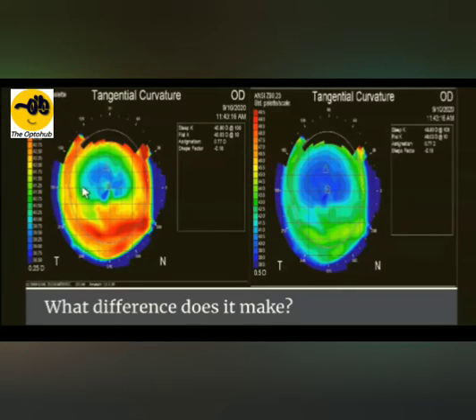So it does not have any unnecessary data points or unnecessary shades. It utilizes all the shades to give some color on the cornea, right? So over here, auto scale is giving a very basic pattern. Now let's have a look at this on the right side.